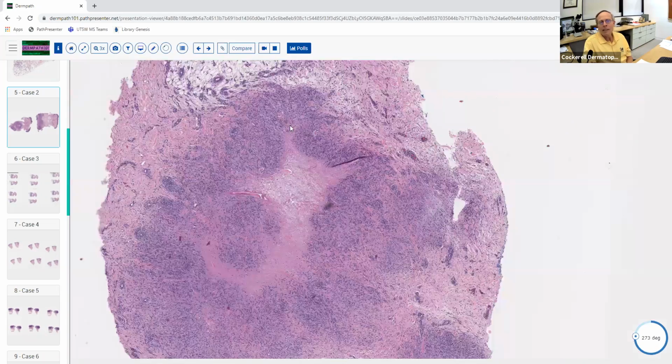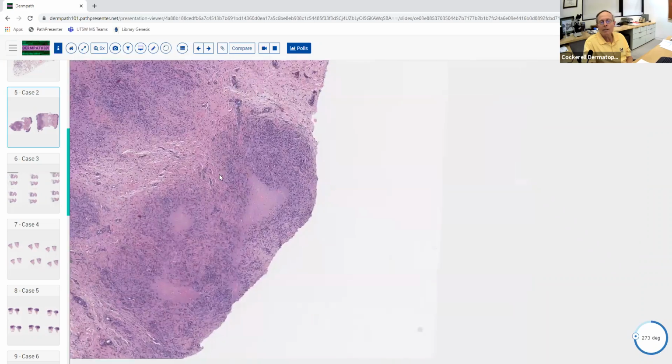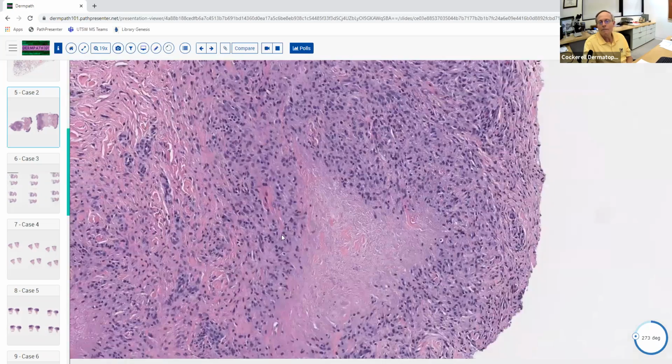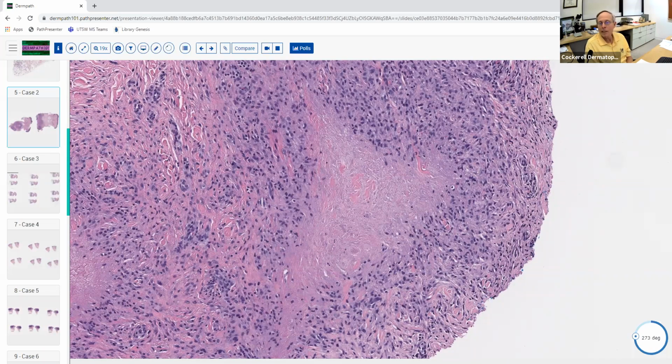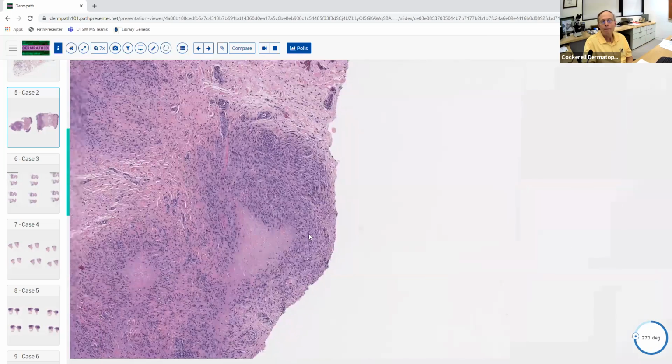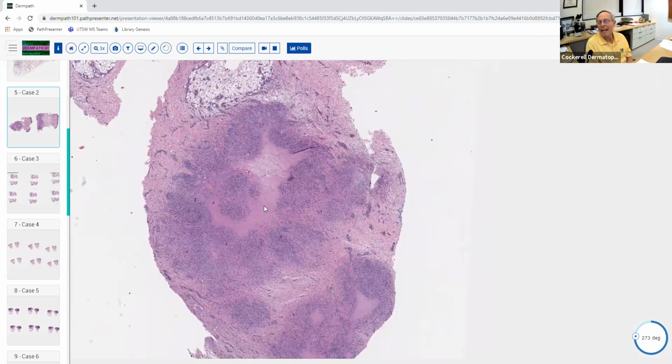And there's basically, well, you tell me, what are some other patterns of GA that we see both histologically and clinically? Like interstitial GA? Good. Interstitial GA, which clinically can look like this sort of pink nondescript patch almost. And clinicians never think about that. So that's good. That's one pattern that we see. There's a couple other patterns though. There's just a classic old annular GA that we see. There's also perforating GA, where you actually get transepidermal elimination of the granulomatous infiltrate. So that you can see.